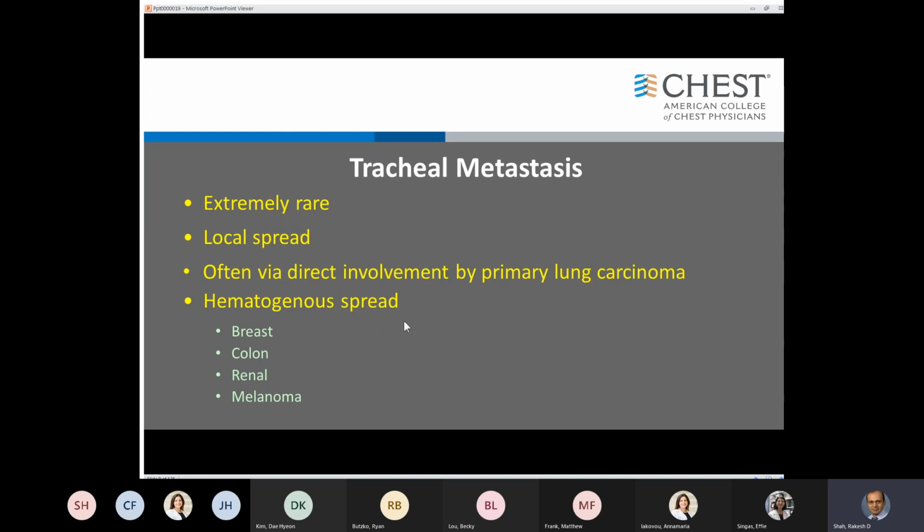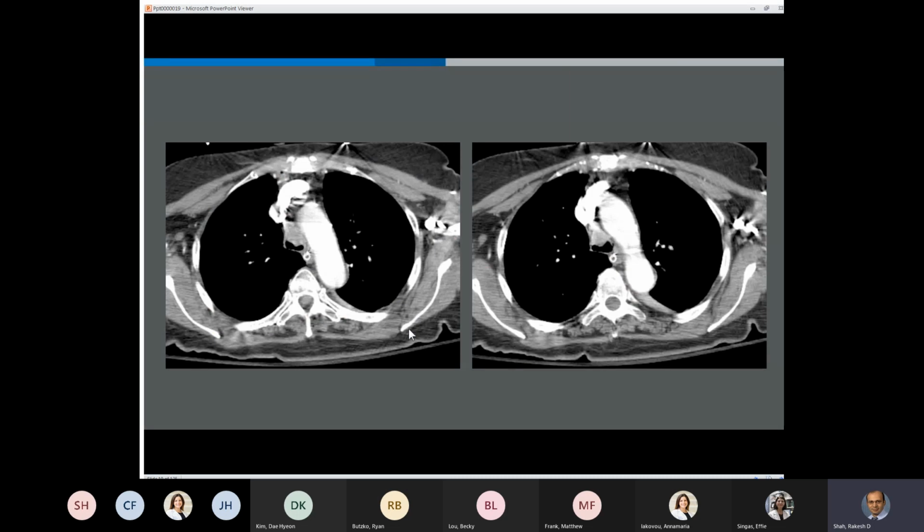So see, this is radiology. I'm going to show you a lot of images. And so just sit back and enjoy.